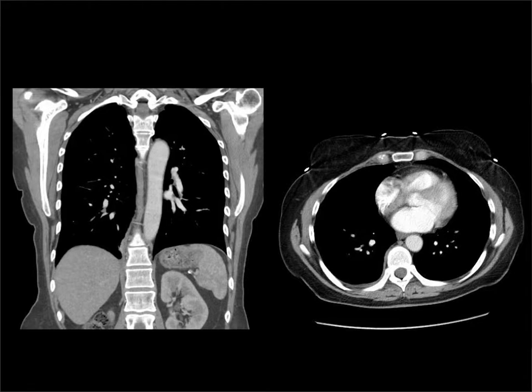And here's the same thing on an axial CT. We have the lung coming in, goes around the lateral side of the aorta, and the line we're seeing is due to the X-ray beam hitting that interface here. And you can see there's no such interface on the other side of the aorta.